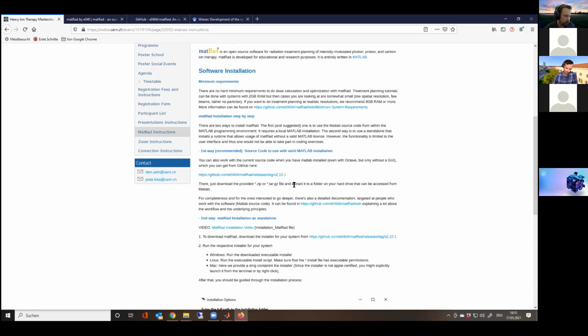Okay, so I know that this is now the other way around, but since the download of the standalone might take longer if you are doing it now and haven't done it before, sorry, I just saw the chat message, and I was going to say it anyway. So we will start with the standalone installation for those who don't have a bare MATLAB installation.